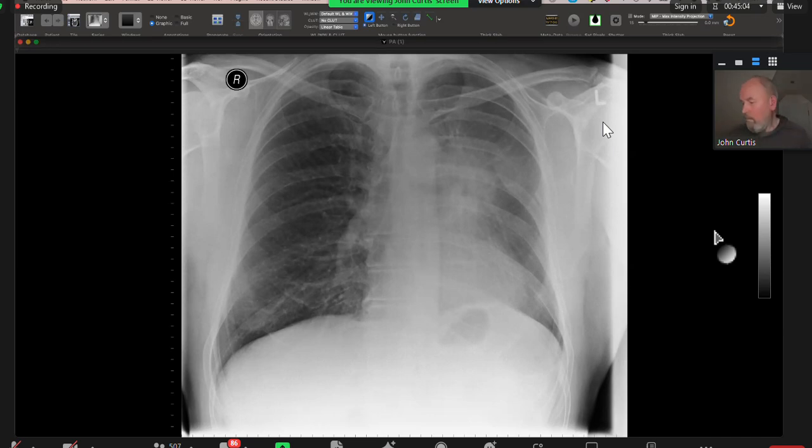That's seen in the right hilar area. Left hilar area, but don't worry, that's fine. Yeah, left hilum. So my next step is fast track chest CT scan with IV contrast for better characterization of this. All of that is absolutely right. So you put the patient through a CT, etc. Can you see anything else on the film? I will look if there is any metastasis seen elsewhere in this film.